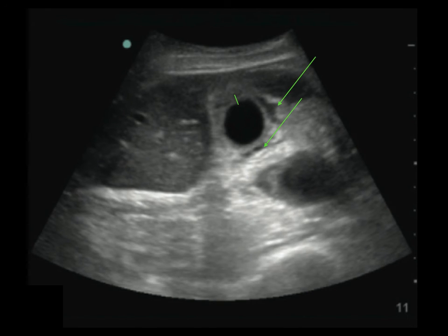So the real answer is that first, whenever you're asked to make a judgment based on a single ultrasound image, always ask to see more images. For time's sake, I'm going to tell you that you performed a very thorough evaluation of the patient's gallbladder and you found no stones. The rest of her exam is consistent with what you can see right here.